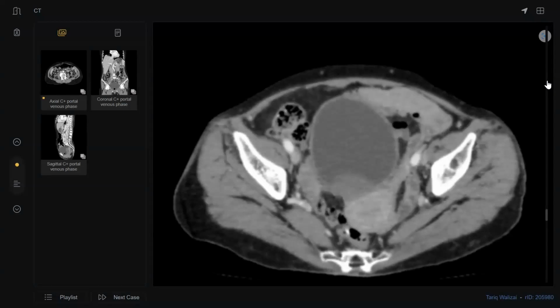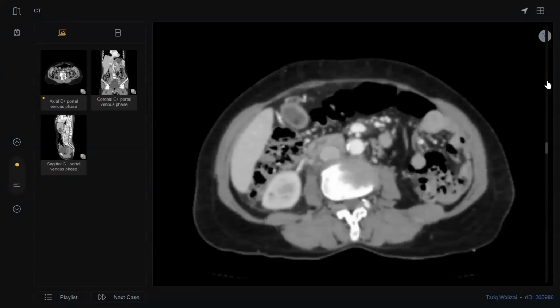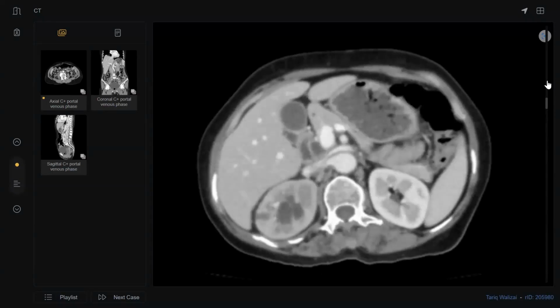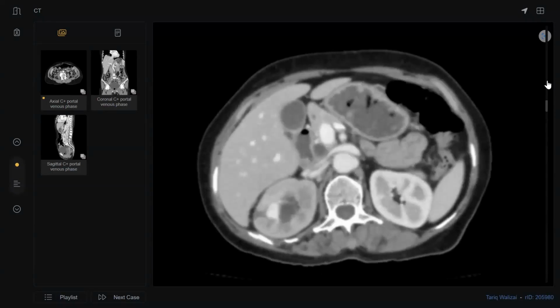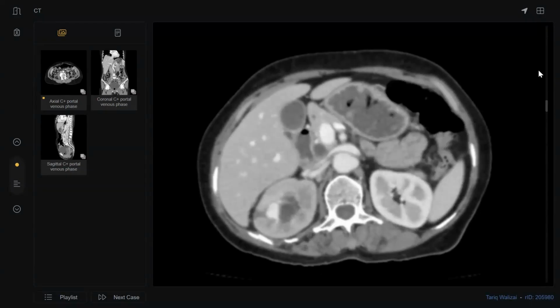I didn't give you the pre-contrast. In my routine practice, I should compare with the previous pre-contrast. And second thing, it is dependent, so it could be a hematoma also in the dependent location. Look here, doctor. What happened here?